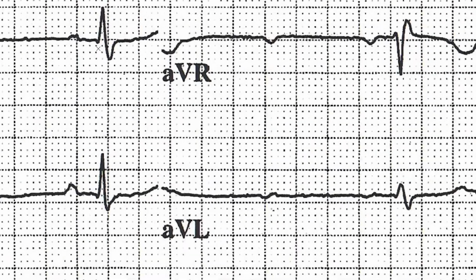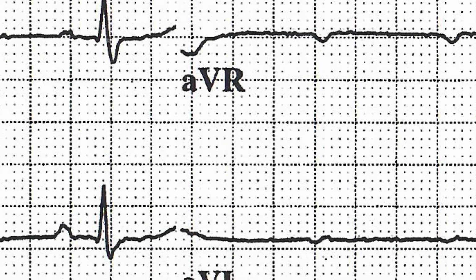And I want to confirm that by looking at the lateral leads. Here I'm in lead one. Look at this. This S wave is supposed to just pop down and come back, but no, here it slurs. And if you were to measure this QRS, here you get 1, 2, 3, a little bit over 3, maybe right at 3. So here it's at 120.